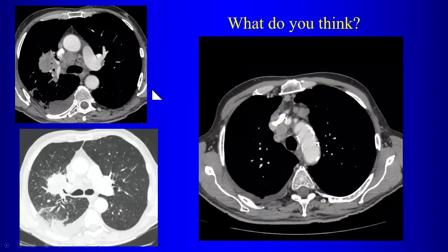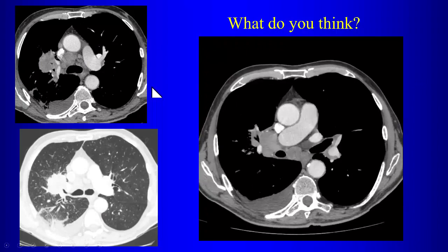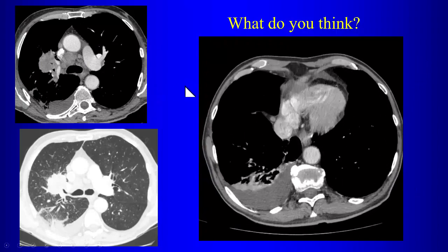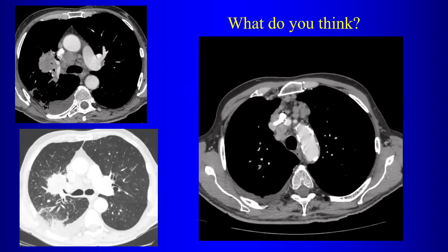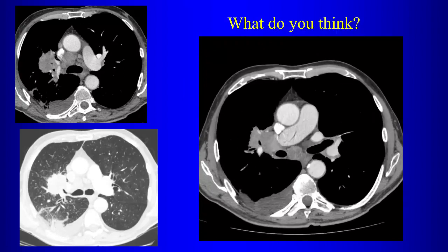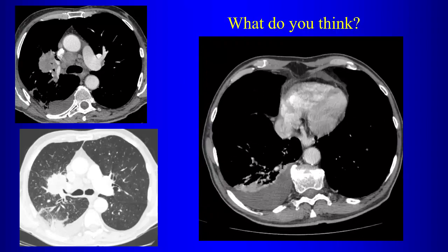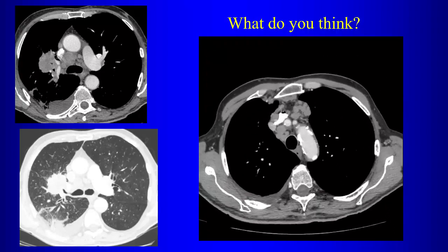So this patient comes in for a follow-up CT scan, is being treated for lung cancer, right? We're doing follow-up CT for lung cancer. So just a routine chest CT protocol for lung cancer on an outpatient. So in addition to describing the tumor and all the other stuff, the fusion and everything else, there is something else you should notice. What is that? It's involving the right, like there's filling defects in the right lower lobe part. Yeah, there are pulmonary emboli here.